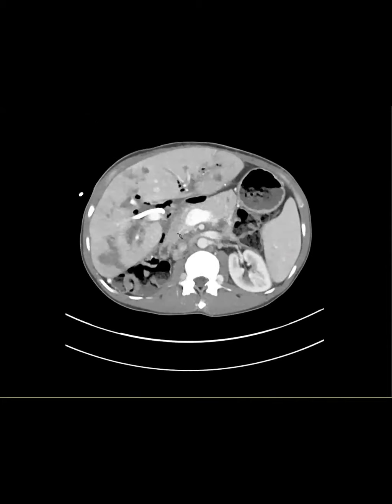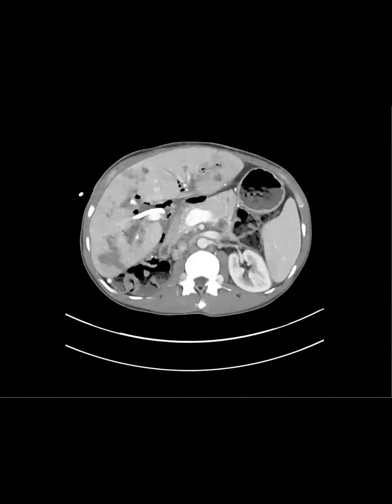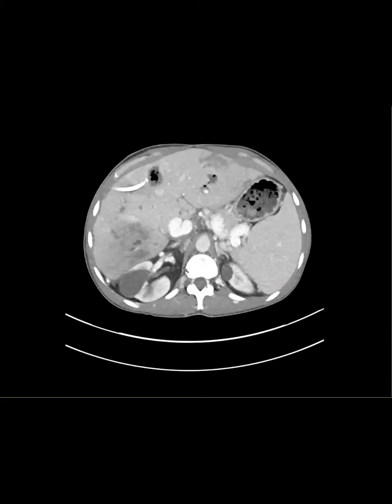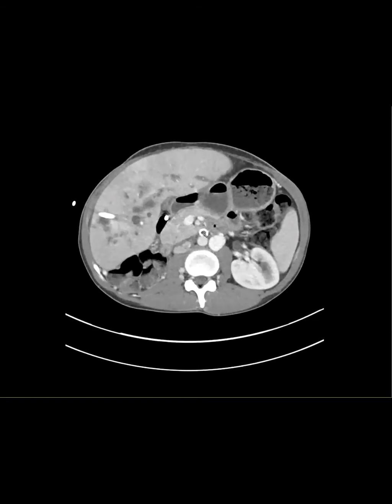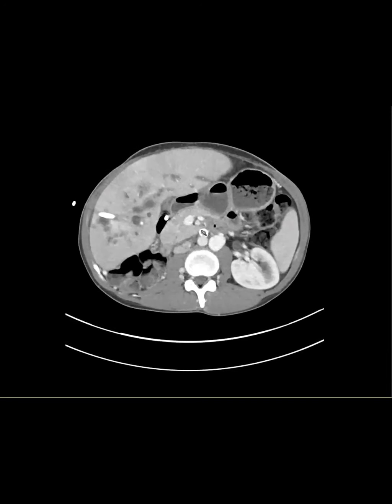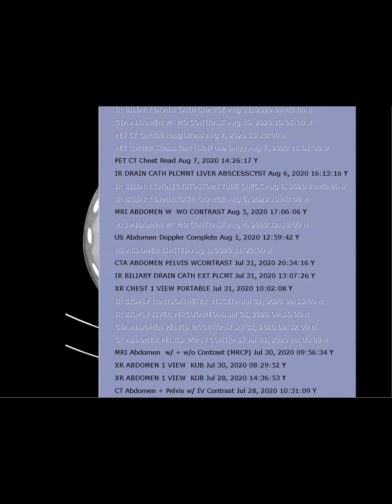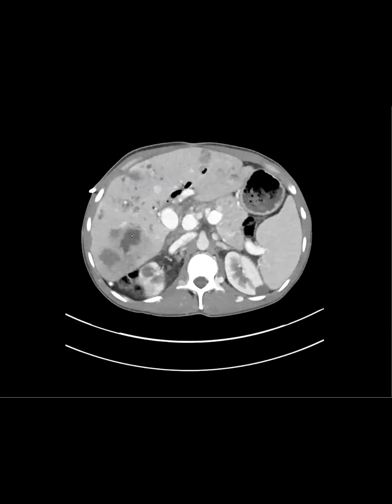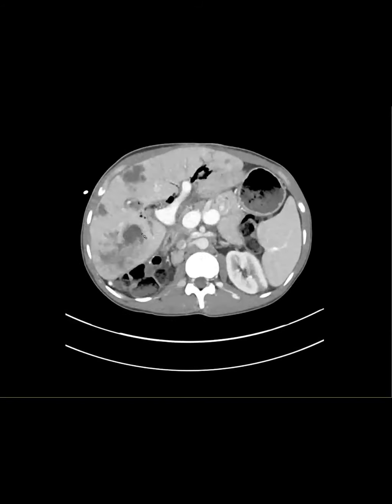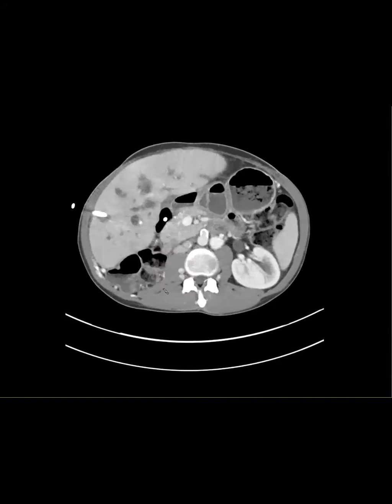Like this is peribiliary necrosis, and we will check the hepatic artery patency. Yeah, exactly. So this was multiple areas of biliary necrosis. And exactly, the hepatic artery, you can see that this is a part of the jump graft, and it's patent proximally, and then right there it goes out. So this was hepatic arterial occlusion leading to multiple biliary bilomas. At this point we've got drains in some of them, but it's pretty severe and they're considering doing a retransplant.